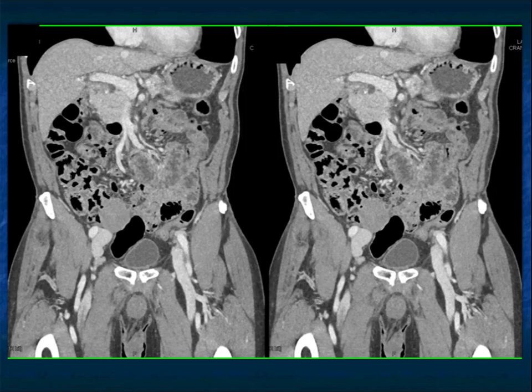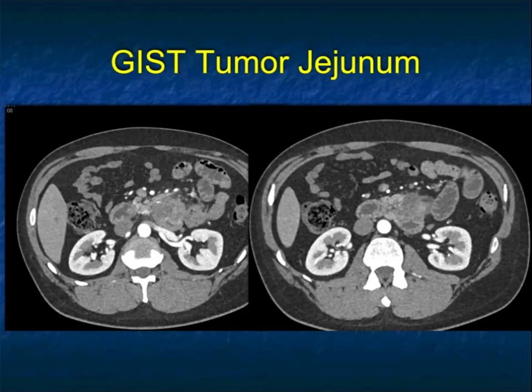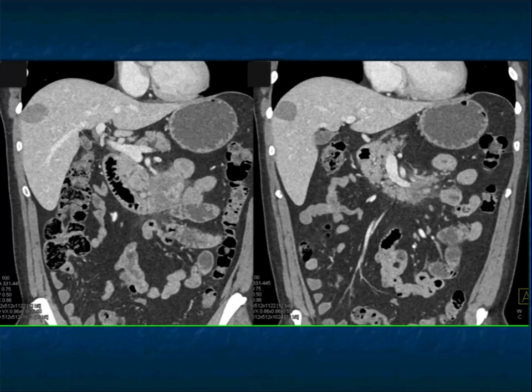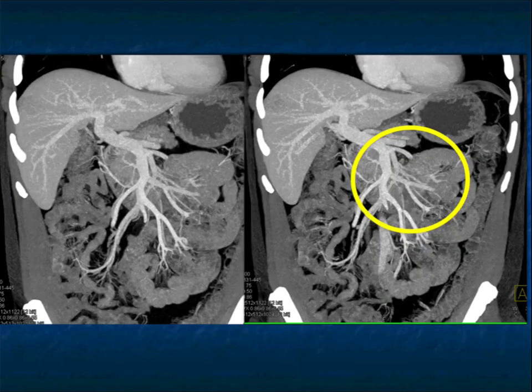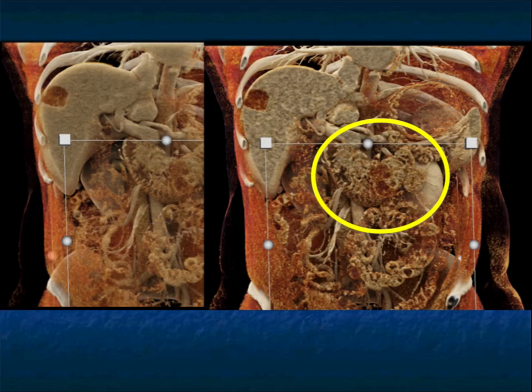One of the things GIST tumors show nicely in this case, even when they're large, they don't cause bowel obstruction because they're exophytic in nature, and that becomes very important. Now, sometimes they're very bulky, they go beyond the lumen, they can ulcerate. Here's a GIST off the proximal jejunum, large, bulky tumor, necrosis, adenopathy nearby, and you can see some of the irregularity of the vessels of the jejunal branches of the patient's SMA. And again, here on the venous side, some of the venous involvement of vessels off the patient's SMV and also off the SMA, all nicely shown.